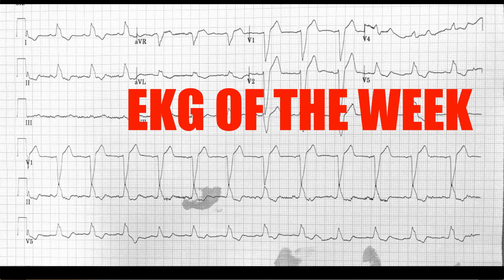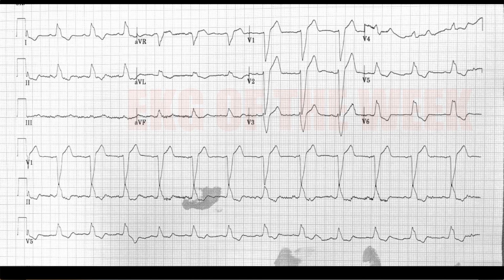Walk through another real-life EKG and talk about some of the fine points of interpreting it, or maybe not so fine. I am just a simple country EMS doc, and so let's hit the high points of it and maybe some of the low points as well. Here's our EKG this time.